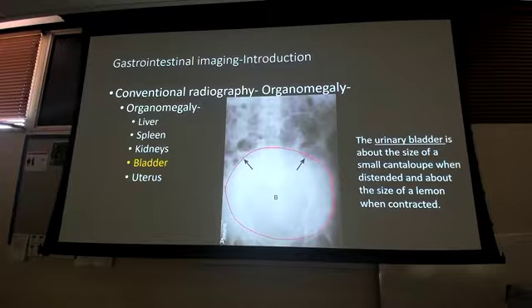Now, most of us aren't going to get there because we're going to go to the bathroom. It's going to force itself out, right? But if there are other issues, urethral stricture, something going on with the sphincter, something that's not allowing the urine to leave the bladder, this can happen. Or, more concerning, what's more likely that's going on here? Not a stone, cancer. Likely bladder cancer, more likely. I can't tell with just the x-ray, but, all right, I'm gonna get a CT to try to find out more, figure out what that mass is.